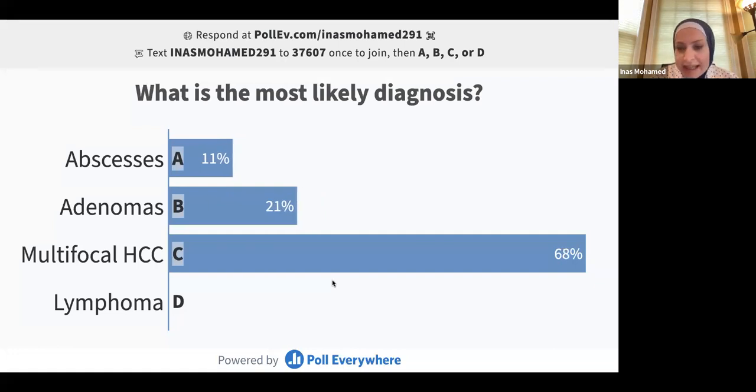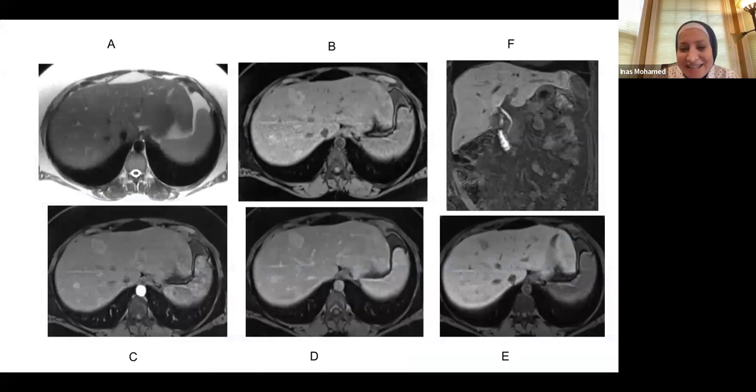Okay, perfect. So actually, these are adenomas. We have two tricks in this case. The main thing that grasps an adenoma is the T1 hyperintense signal. There are different subtypes of the adenoma, and we're going to talk about that in a second, but this T1 hyperintense signal is in a normal-looking liver that doesn't look diseased. And it is arterially enhancing. It did not wash out.